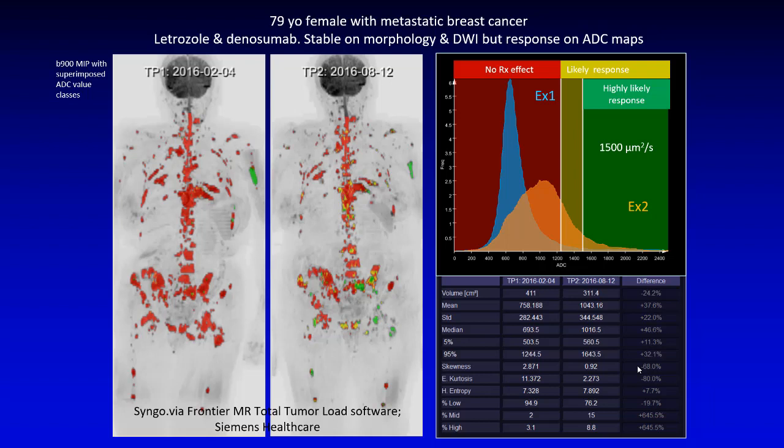Some areas will die, some areas will not die. And that's what the histogram is representing. So this is an apoptotic mechanism, right? So that is tumor cell kill in a different way.